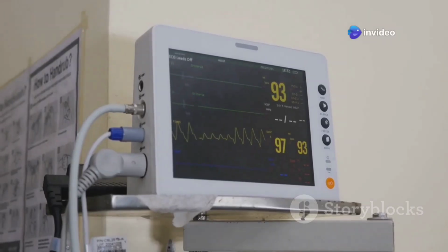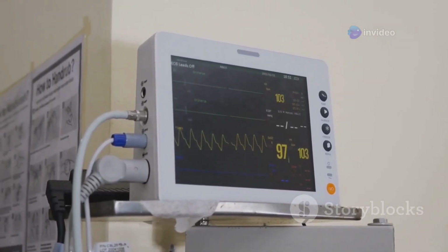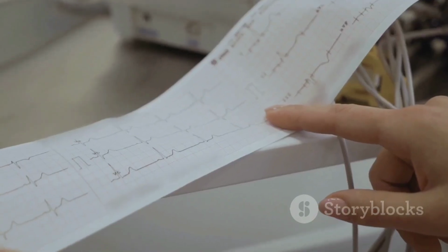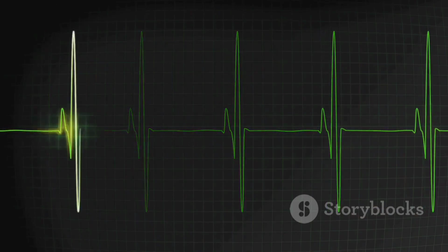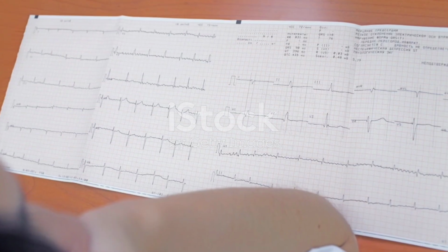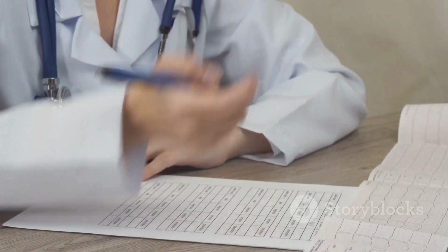In this video, we are not discussing anything about the theoretical portion, like where the leads are placed, why the leads are positive, why the leads are negative. That's nothing. We just discuss here how you can clinically diagnose an ECG in just 1 to 2 minutes. So let's start.